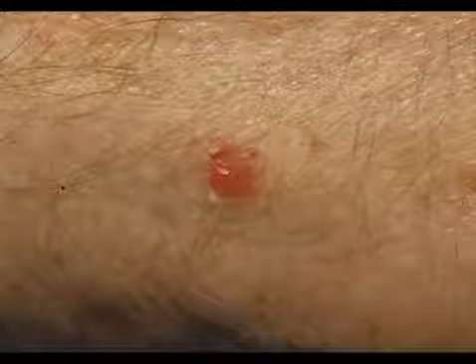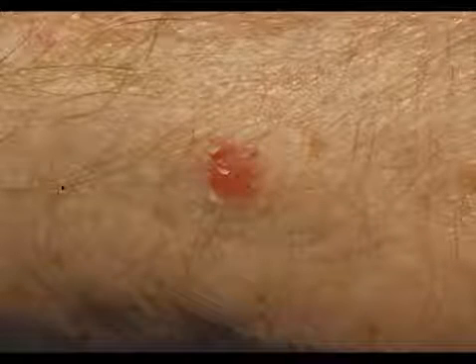Here clinically a similar lesion, and we can see scaling again, unpigmented plaque. Dermoscopy, we see again dotted vessels here and here and here, but there are also some larger dots that may be coils. So we have a polymorphous vascular pattern. Sometimes it's difficult to differentiate between coils and dots, but what is not so difficult is that the vessels here are arranged specifically.